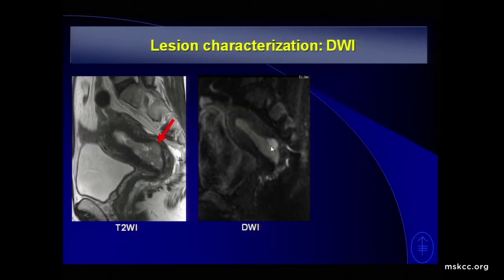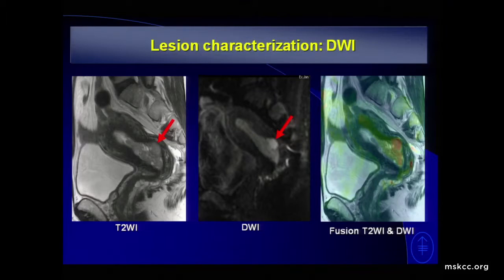But you can see here how different those tissues are, with the polyp here being less dark and the cervical cancer, as it is here, showing really restricted diffusion, bright on the diffusion-weighted images. And indeed, this patient went for trachelectomy for a cervical cancer rather than for atypical hyperplasia in a polyp or query endometrial cancer. Again, very useful to plan this preoperatively.